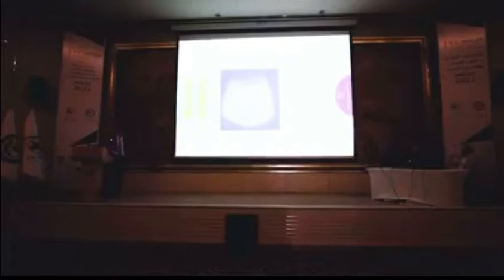This is the choroidal tissue. This is the posterior aspect of the choroidal tissue after removal of the sclera. So you can see highly vascularized tissue under the electron microscope. And this is the choroidal tissue, and you can see by indocyanine green angiogram even the vortex veins.